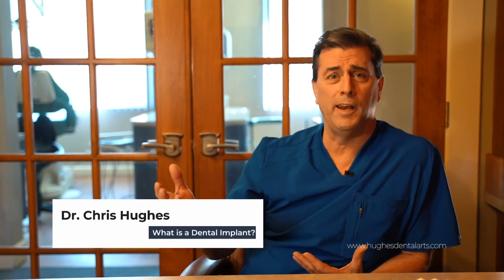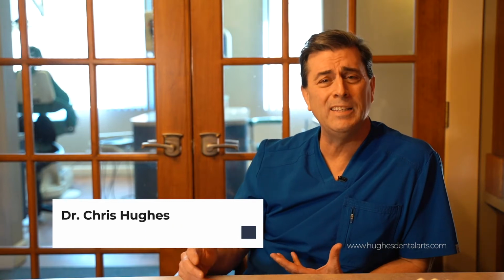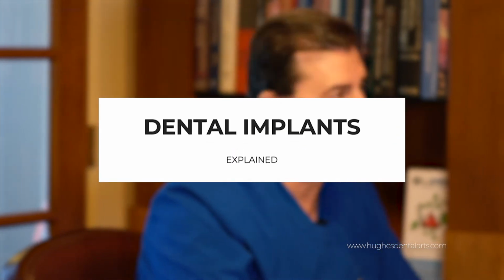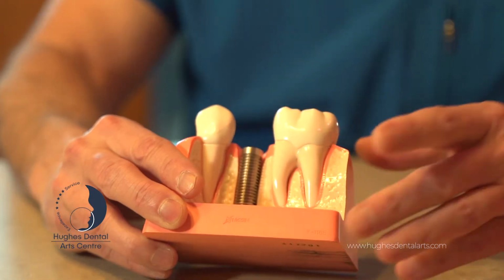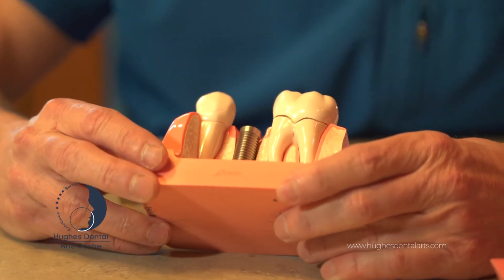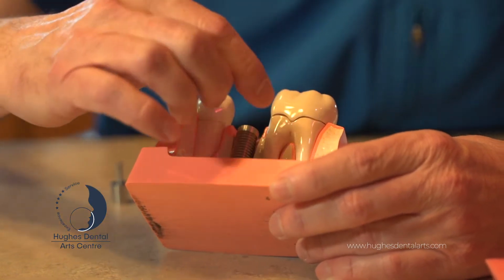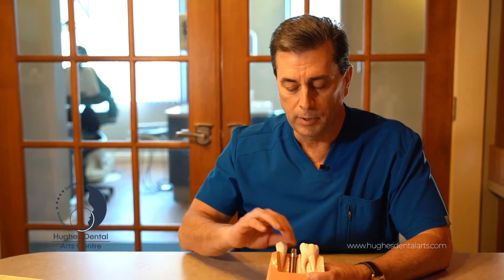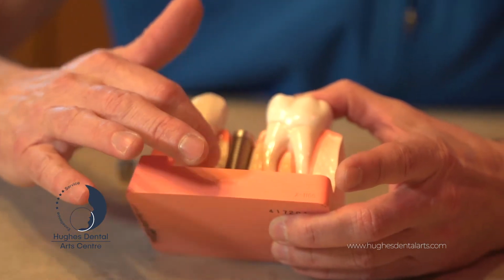So the first thing that everybody wants to really know about is, well, what really is a dental implant? So that's what we're going to talk about right now. This is a great model to look at. Here we have some teeth and we have a cutaway of what a dental implant is. What most people don't know is a dental implant is really the replacement for the root of a tooth.